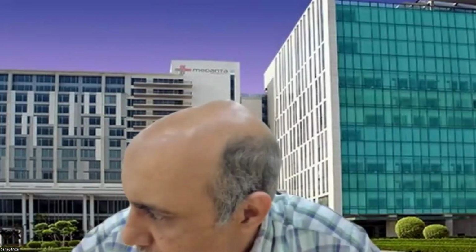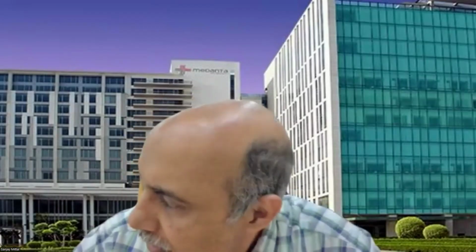As I said, if it is normally contracting, the number given is 1. And the more severe the wall motion abnormality, hypokinesis would be 2, akinesis would be 3, dyskinesis would be 4, and aneurysm, if you have diastolic outpouching, it would be 5. So the higher the number, the more severe is the segmental abnormal motion. So each segment would be required to be scored similarly.